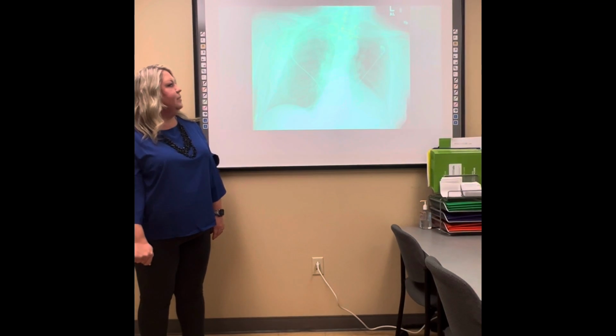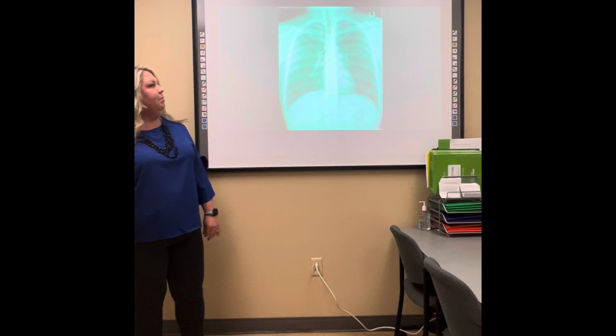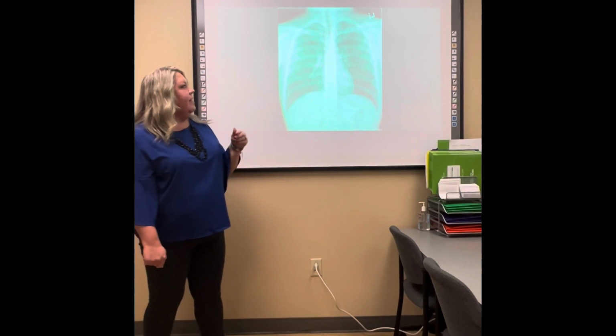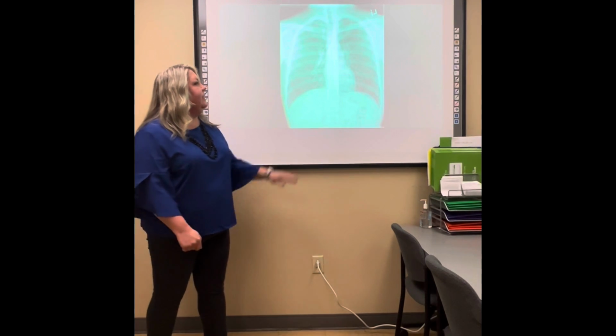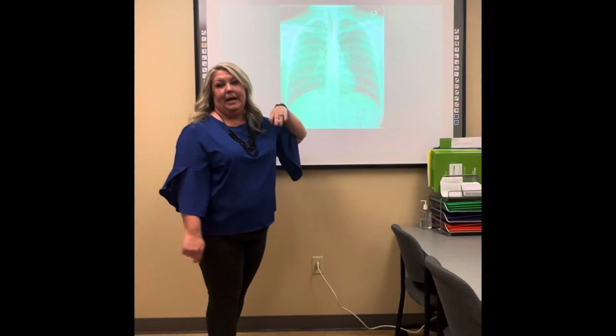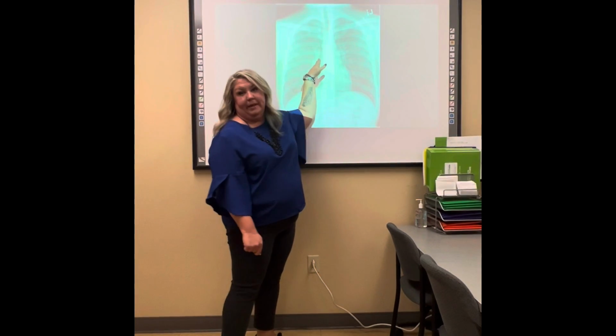You can go to the next one. Okay, this is another example where it is not midline and that it's also rotated and they're not equal distances apart. What this image is showing you also is where we talked about how the trachea bifurcates. So it's showing you that bifurcation and how that's not midline to the body.